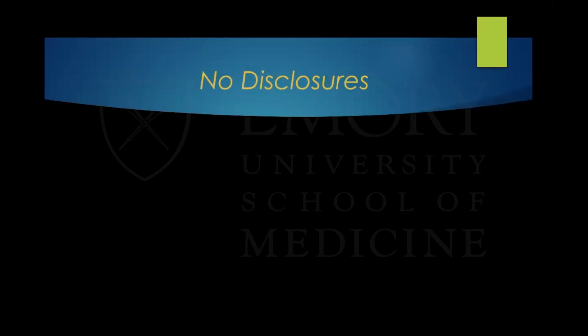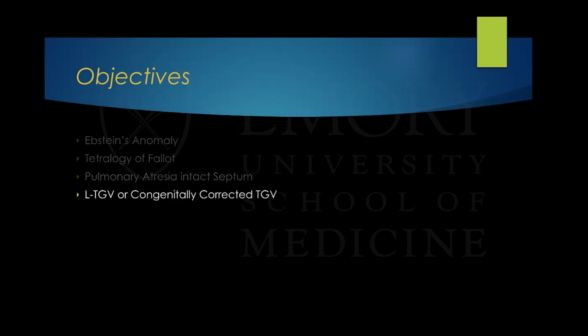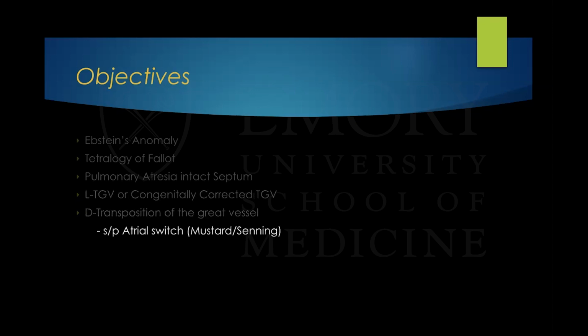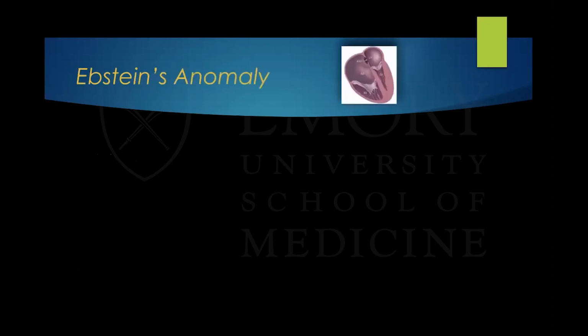I have no disclosures. And the objectives of today's meeting will be Ebstein anomaly, Tetralogy of Fallot, pulmonary atresia intact septum, L-Transposition of the great vessels or congenitally corrected transposition, D-Transposition of the great vessels, and we're going to touch the atrial switch and arterial switch. And at the end, we're going to do tricuspid atresia, Atriopulmonary Fontan circulation.